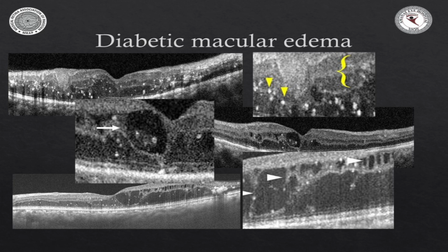Again here आप देख सकते हो कि यहाँ पे एक cyst बनी हुई है और cyst के अंदर जो है herniation हुई है hyperreflective intraretinal foci की, and when these configure themselves around the wall of the cyst we call this a pearl necklace sign because it looks like just a pearl necklace. ये सारी जो नुक्ते से हैं ये marginalize होके cysts को line दे देते हैं. That is a precursor for hard exudates.